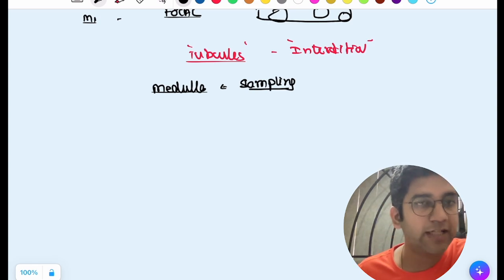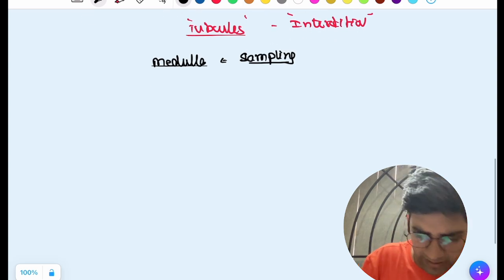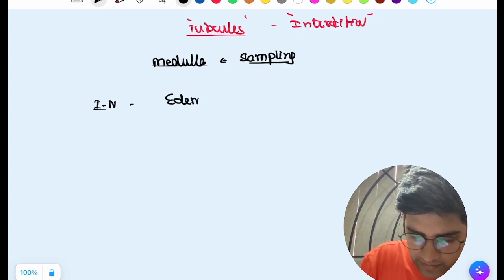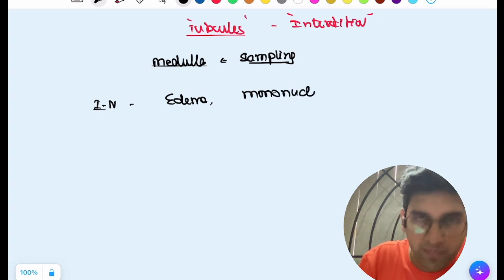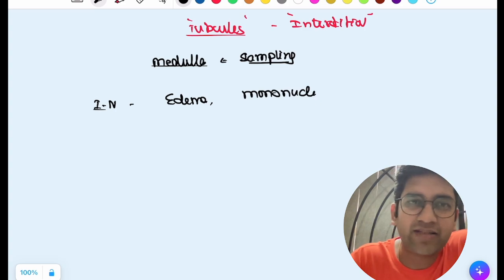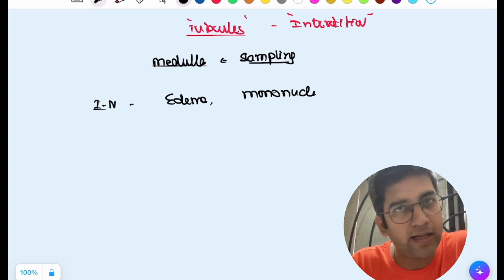But like I said, it's primarily the interstitial nephritis and the tubules, right? Interstitial nephritis is very non-specific. You might have interstitial edema, and there'll be infiltration of lymphomononuclear cells, right? So this is what you're going to see primarily in the interstitium. A little bit of plasma cells. Sometimes you might see neutrophils and eosinophils, but not much, right? And these are more predominant in the early stage of the infection. Mostly it's going to be inflammation, edema, mononuclear cells, and be patchy.